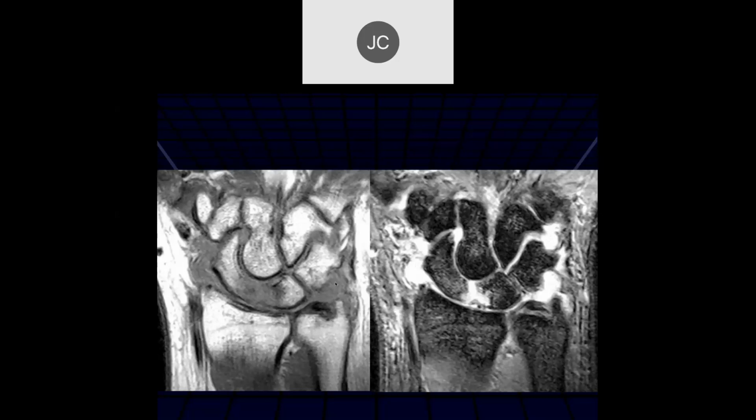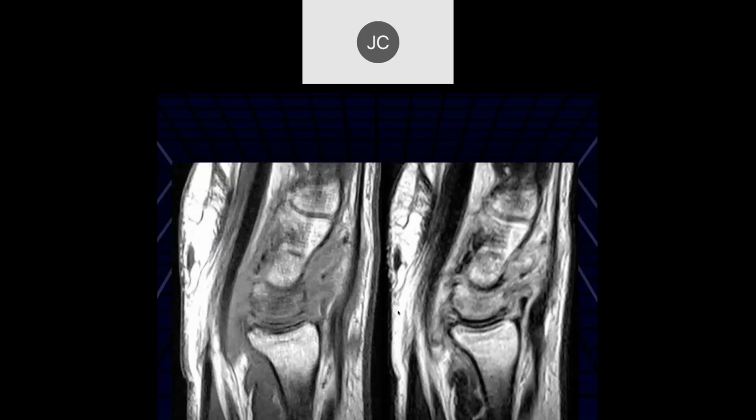If this is a T1 weighted image, it's a little bit high in signal intensity for fluid, so the other possibility is that this could all be just synovial thickening. You just need to look at the pulse sequences, especially the T1 weighted images, to help differentiate that.